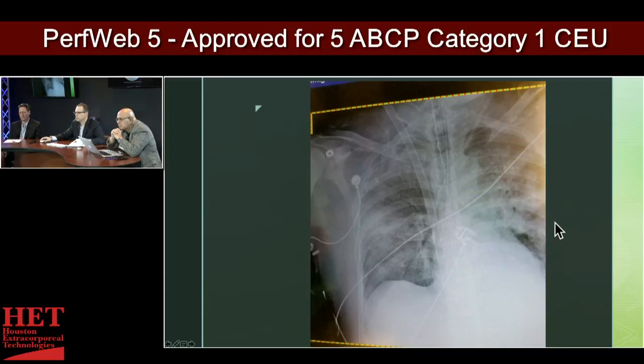And this is the one that you're going to be primarily trying to tease out when you're in the ICU. You've got your patient in from the ER, from the OR. You've initiated ECMO, and you have your venous cannula in the IJ. Now, these next two films are actual films of Patrick's patient.